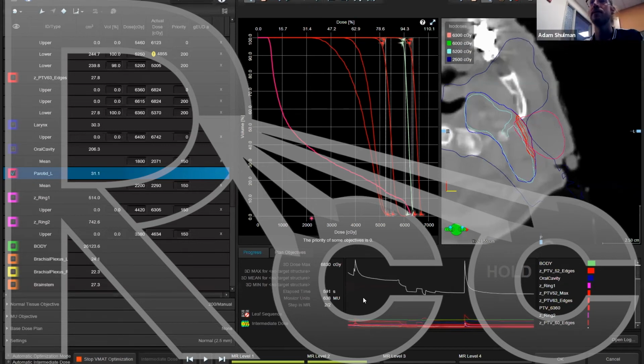So what we do in those cases, we'll do a PTV override of the low density tissue of the lung portion of the PTV. You can even expand it a little bit further, it doesn't matter. We'll just override it to a more traditional lung density, say minus 700.